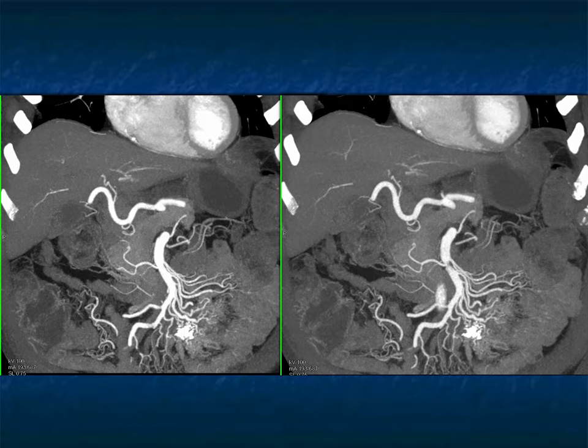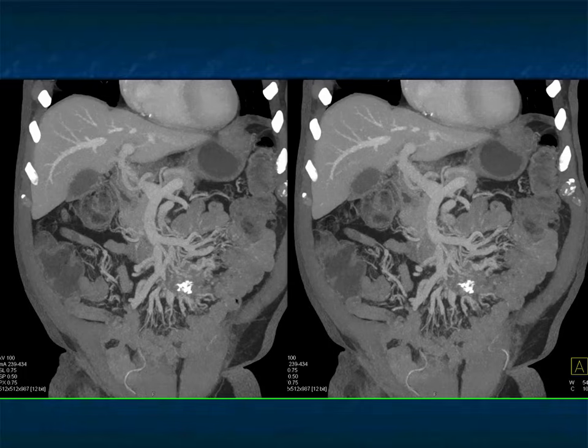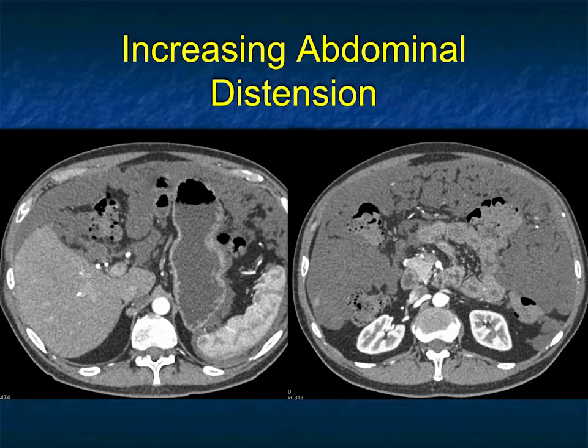If you find a mass in the small bowel as the carcinoid primary, then it's easy. It can be somewhat tricky. The carcinoid, and this was a carcinoid, is more likely to encase the SMA and more likely to encase the SMV with multiple small collaterals, but it can often be a difficult diagnosis. Sometimes biopsy is helpful, but biopsy will often have the pathologist say, well, I don't see a carcinoid tumor. It doesn't mean there's none present. Some people have tried dotatate scans looking for carcinoids, and if the dotatate is negative, then it's more likely that it's going to be sclerosing mesenteritis.